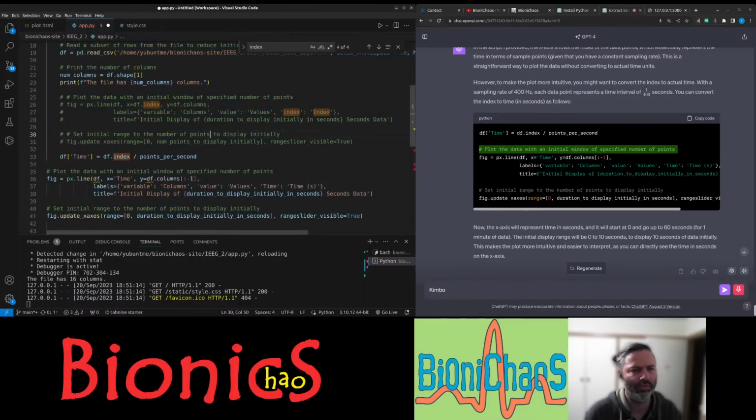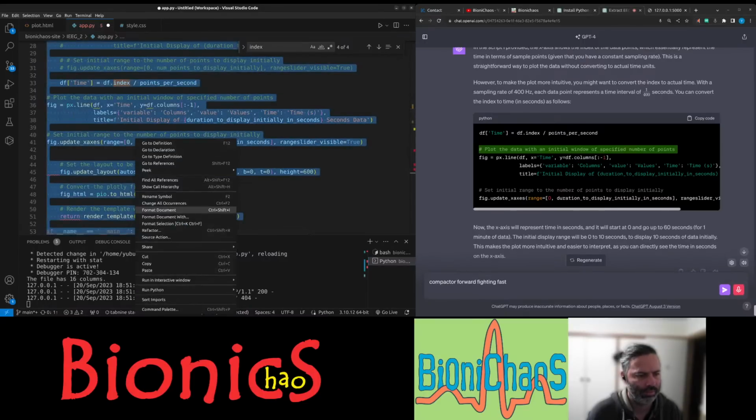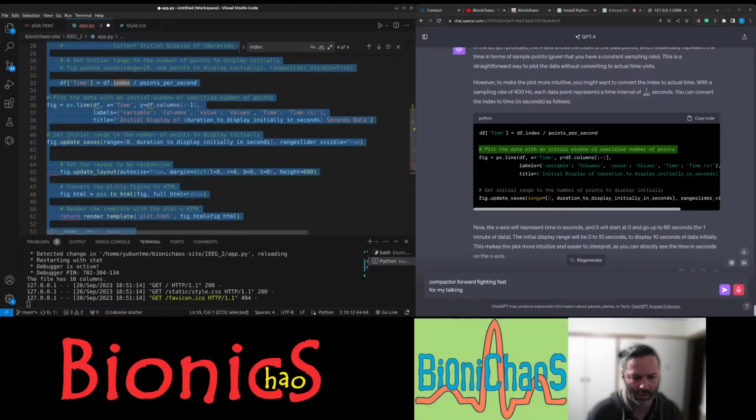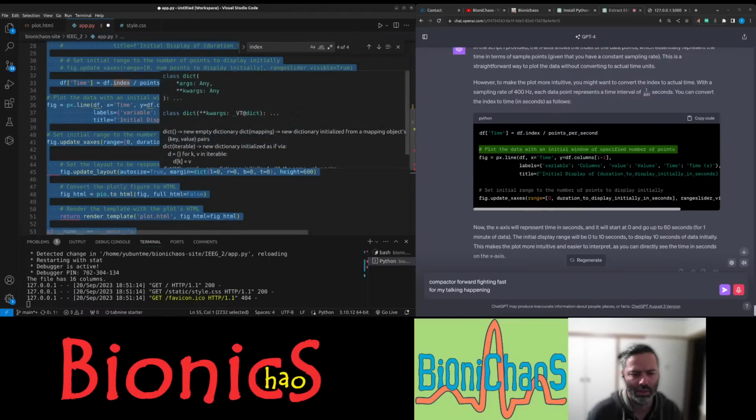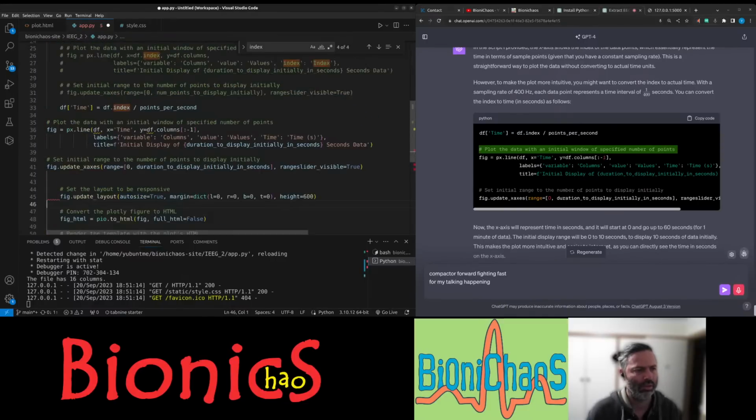Cannot format Python files. Format document. What's happening? Okay.